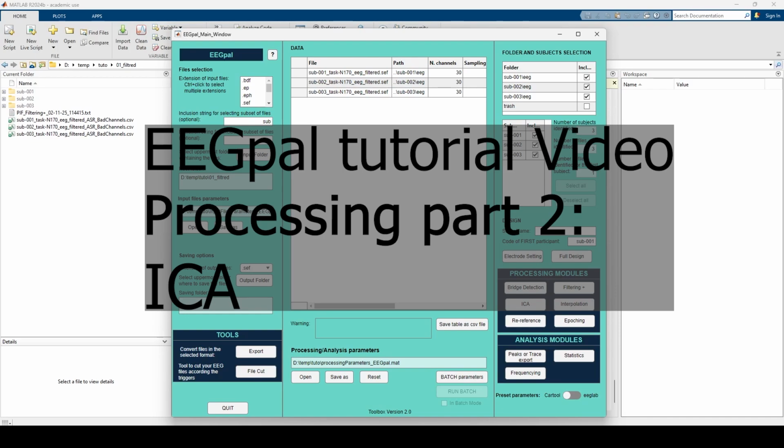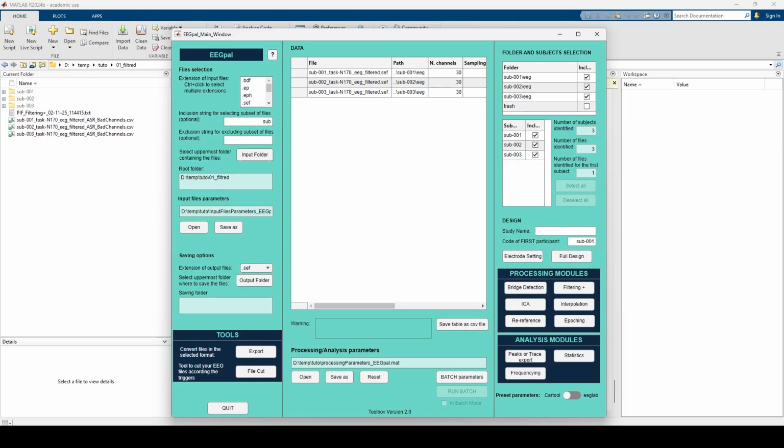Welcome to the second part of the video tutorial on data processing with EEGpal. Today we will work on the independent component analysis, or ICA.